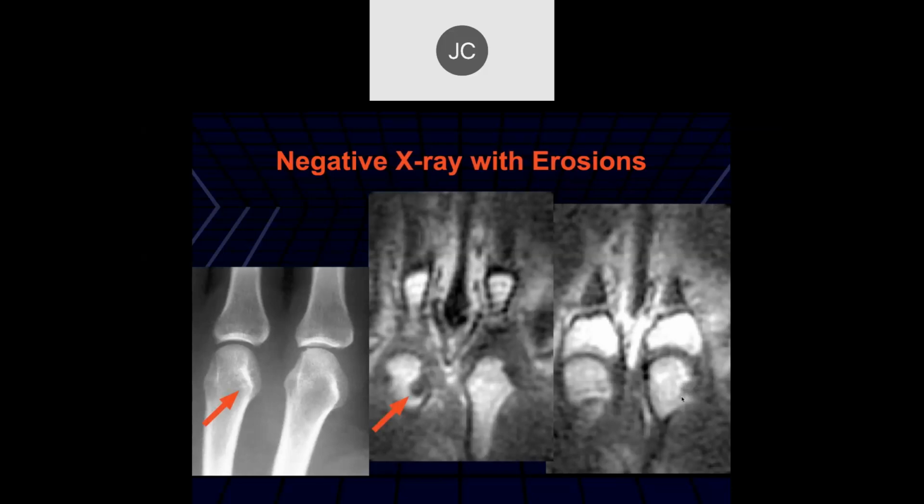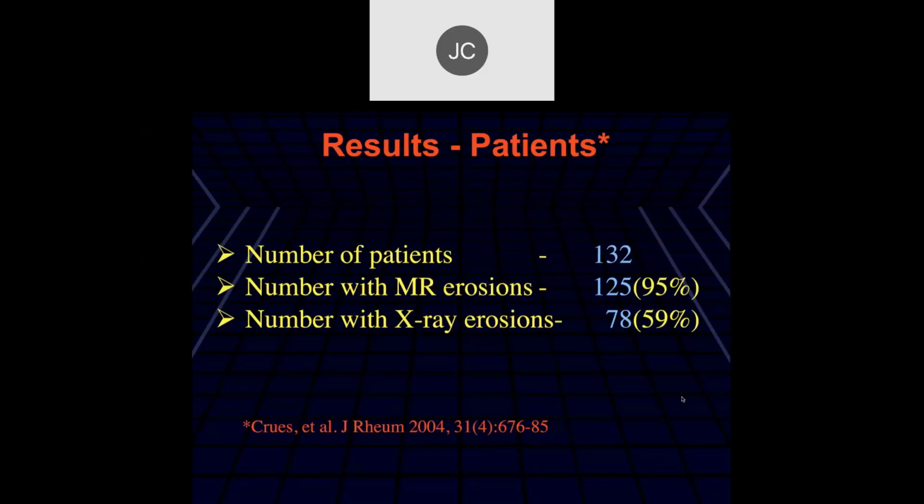Would a CT scan pick any of that up, John? CT would pick these up, yes. If it's just osteitis, then CT won't. But for erosions like this, a CT would pick it up.